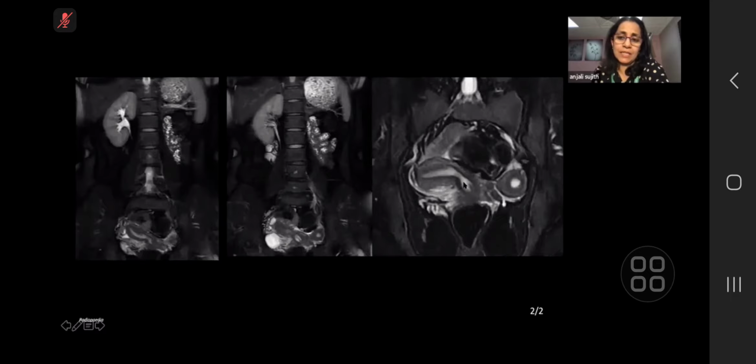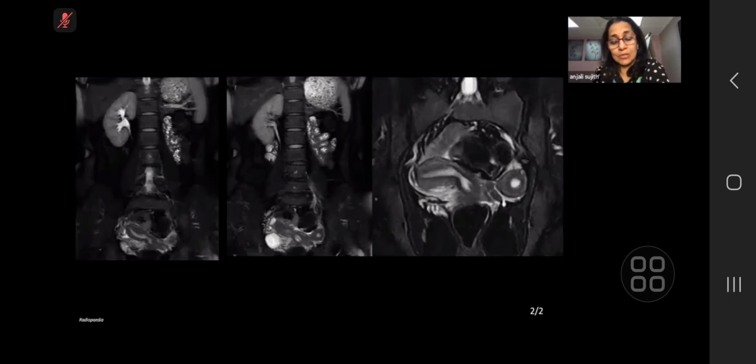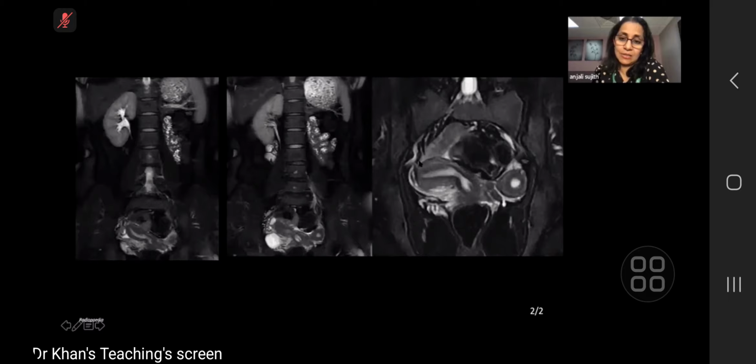Can you see if the two uterine cavities are communicating with each other? I can't see that on the images that I've got. They seem quite separate. Although on the second image, they could be coming down lower to communicate, it doesn't appear so on the views that I've got. I don't think they are. So in the views that you've got, you can see two separate uterine cavities, and they are not communicating. Yeah. The first one has the appearance of a well-formed uterine cavity, and the other one looks like a rudimentary horn, but it's got endometrium inside.